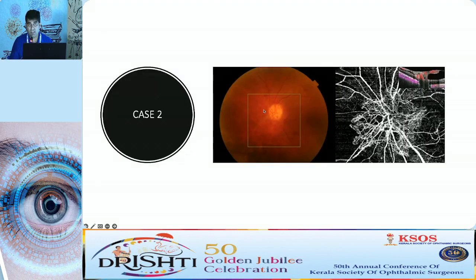Now, this is another patient who was diagnosed as severe NPDR, but the OCT angiography over the disc shows neovascularization, and hence the diagnosis changed from severe NPDR to PDR.